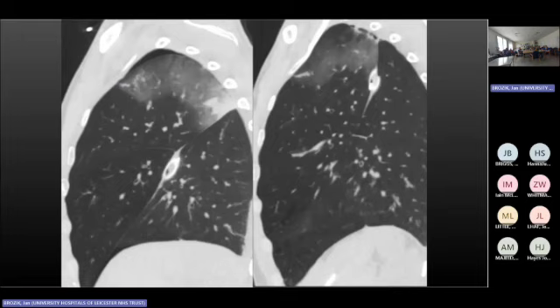So this child presented with life-threatening asthma. We actually have, this is airway disease, yeah, thickening of airways. In the emergency room, someone came to a conclusion that this could be bilateral tension pneumothorax.